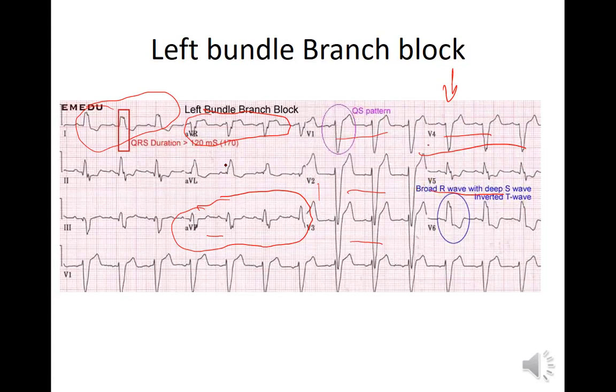Nurse Nava definitely noticed some possible ST depression, but let's look at this. This is really throwing me here. There's ST elevation in AVF. Sometimes you get a reciprocal elevation and depression in certain hearts. So what is this one right here? That's depressed. That's true. But what about the R wave? The R wave is messed up.